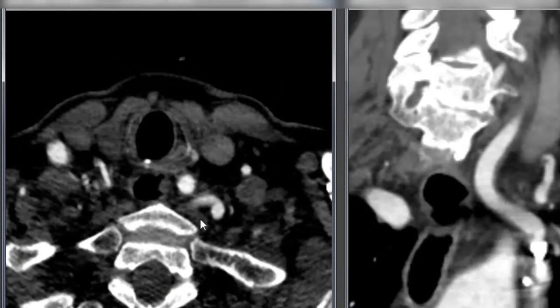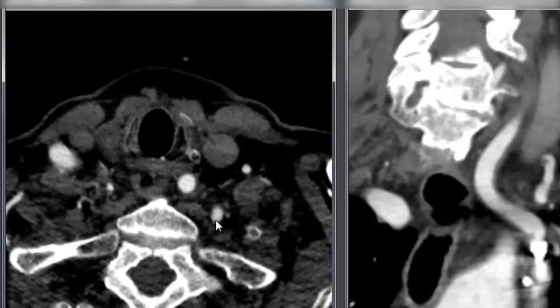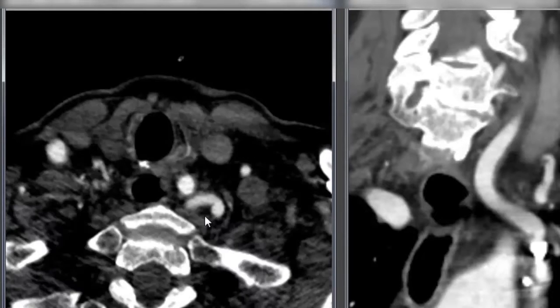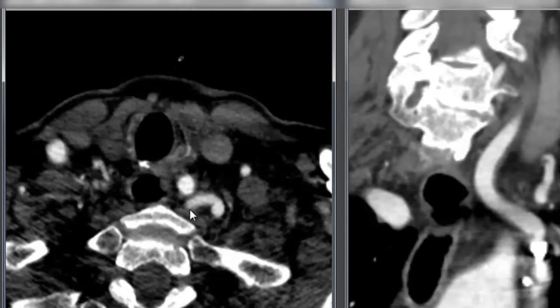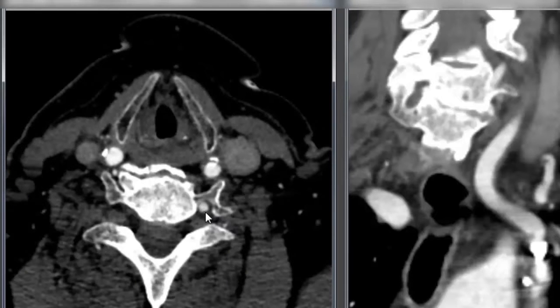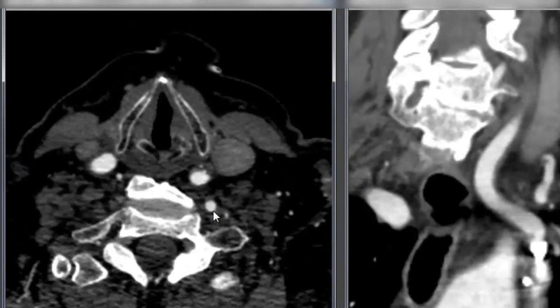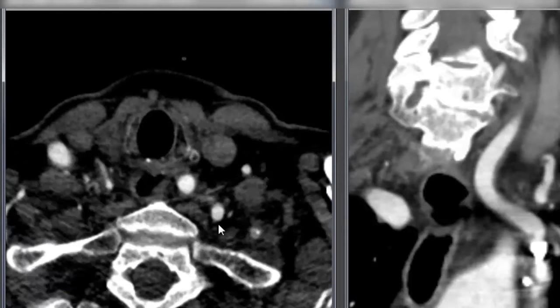And now we've left the level of the vertebrals passing through that transverse foramen, and we're now in the low neck, passing into the upper chest. We're going to follow this vessel. Again, whenever you get disoriented, you can always come back up, find your vessel in that transverse foramen, and work your way down. Keep your mouse nearby to not lose track.